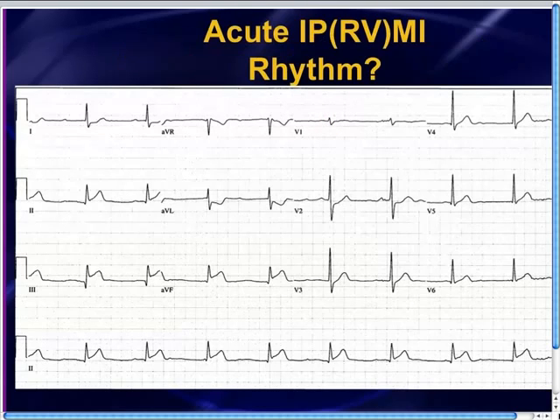So anyway, this person has an acute inferior, posterior, and possibly a right ventricular MI as well. And if you wanted to confirm right-sided MI, then you just do those right-sided leads. Okay, enough about the ischemia and infarction. What I next want to focus on a little bit more is the rhythm, because the physicians taking care of this patient and the EKG machine, and even to some extent the initial admitting doctors, got the rhythm wrong. And I think it's because they relied on the machine.